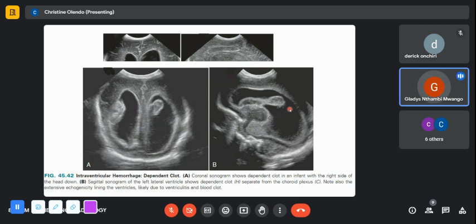Yeah, and it will be a well-defined mass, and you can do vascularity, Doppler, and it should show vascularity, because it's a solid mass, as opposed to hemorrhage, which has very heterogeneous, very bizarre shapes, like the ones she's showing us. Hemorrhage can have a very varied kind of appearance. And then the other thing is that these are premature babies, so you're more likely to have the germinal matrix hemorrhage, where a papilloma would be much more common, maybe in an infant.